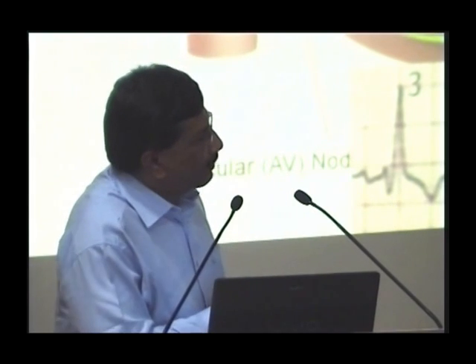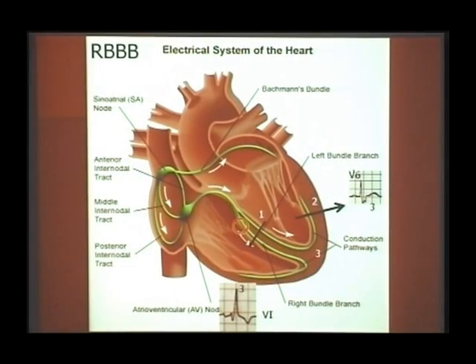So for the right ventricular depolarization, the impulse has to travel through the muscle from the left ventricle towards the right ventricle and then depolarize the right ventricle. So this is vector number 3. Normally we have only 2 vectors: the septal vector, then the simultaneous left and right ventricular activation vector, with a dominant left vector, V5, V6 positive. That's what normally you have.